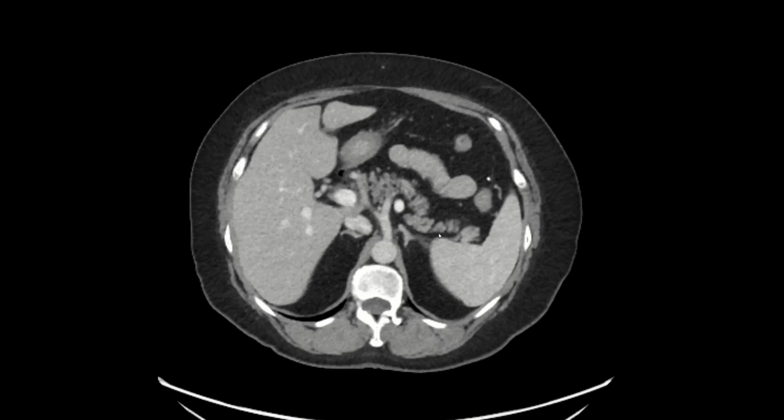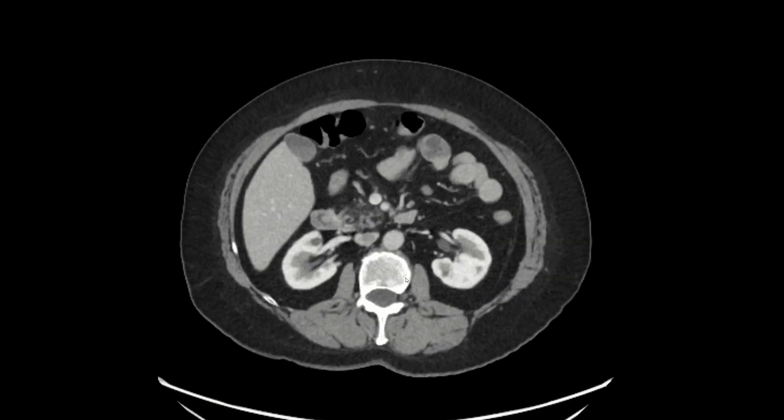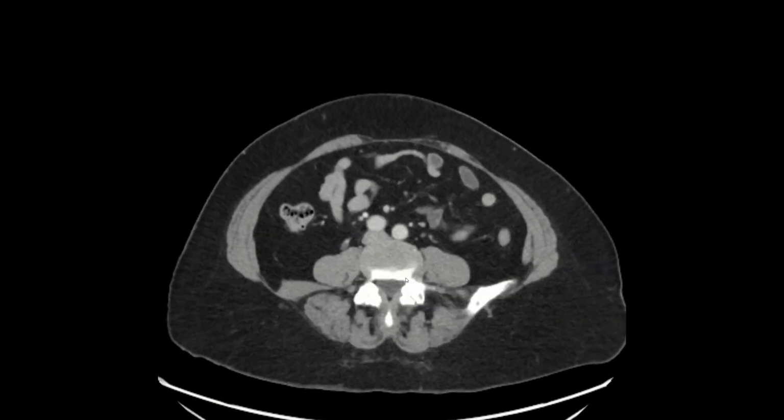I have an interesting case to share with you all. This is a 63-year-old woman who presented with abdominal pain. We performed a CT of the abdomen and pelvis. We're starting at the level of the liver because the findings are more inferiorly.